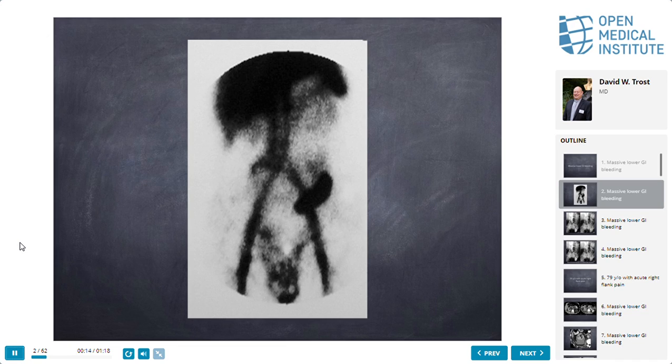Anybody? What kind of scan is this? It's a bleeding scan. And is there any bleeding? Yes, no. Where? What's this? No. If there was another kidney, there'd be another one over here.